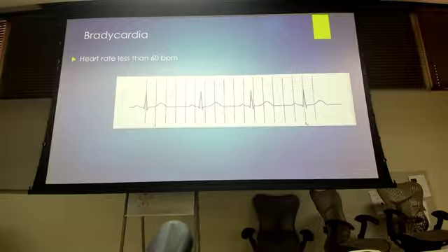Now, you could say, well, I could just times it by 2. Well, it's not advised, because if you keep doing that, we're not even going to be close to what the heart rate is. So determine if you can use the counting method. If not, if you have a 6-second strip, that's fine. If it's something that I want you to be like this, I'll tell you, this is a 6-second strip. Okay? But if it's something I want you to figure out, you better look at the bottom and look for those lines. And we need to have 3 lines at the bottom to tell us it's a 6-second strip.